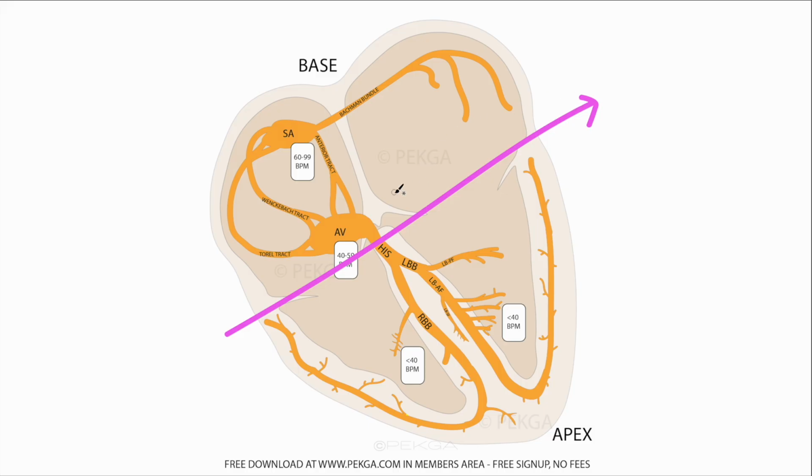Excuse me. So as you can see here, if we were to draw a 90-degree angle here and draw a line, we would roughly get our lead 2. Now our lead AVL here is very isoelectric, so it just looks like a little bit of artifact on a baseline, versus every single other one is looking very healthy in a sense that we're getting good signal.